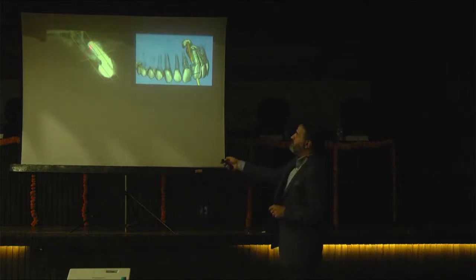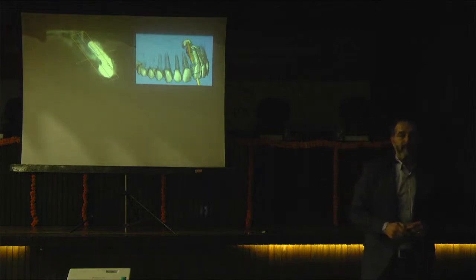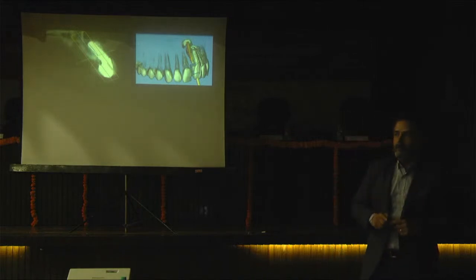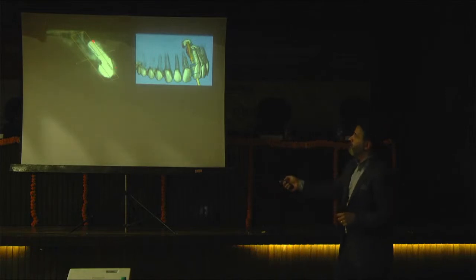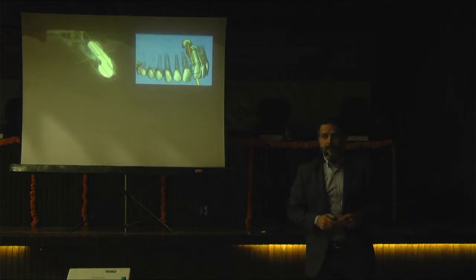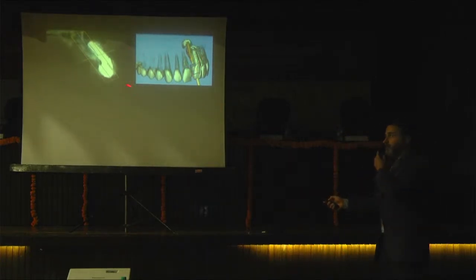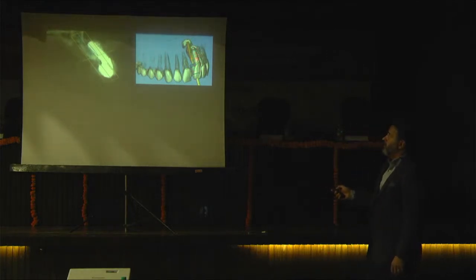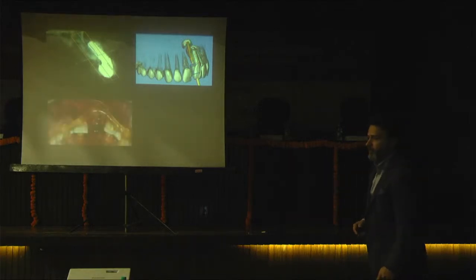I don't know if it is seen here or not. The patient was suffering from the implant, which was located in the 21 area of the upper jaw. The implant was located very buccally, and there was bleeding. In the CBCT, after matching the DICOM and STL files, you can easily see that the implant is placed buccally and it must be here. That's why we had very big problems.